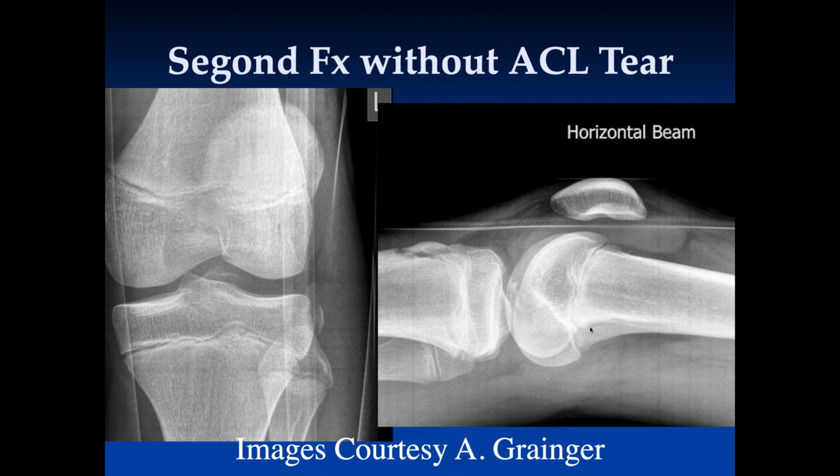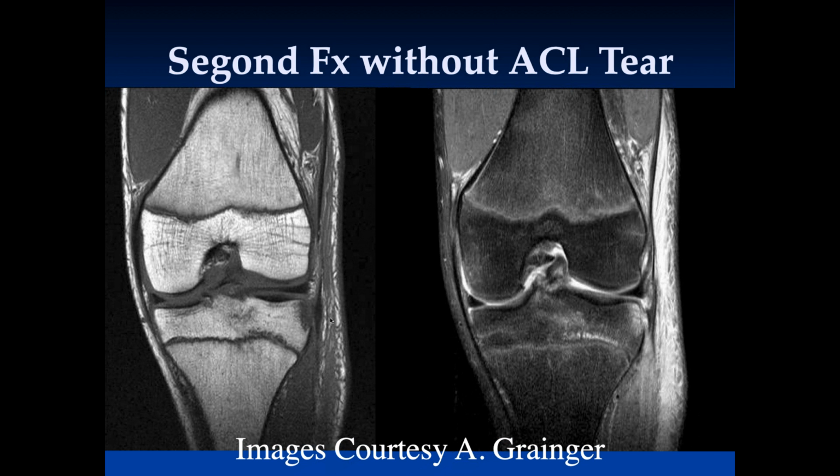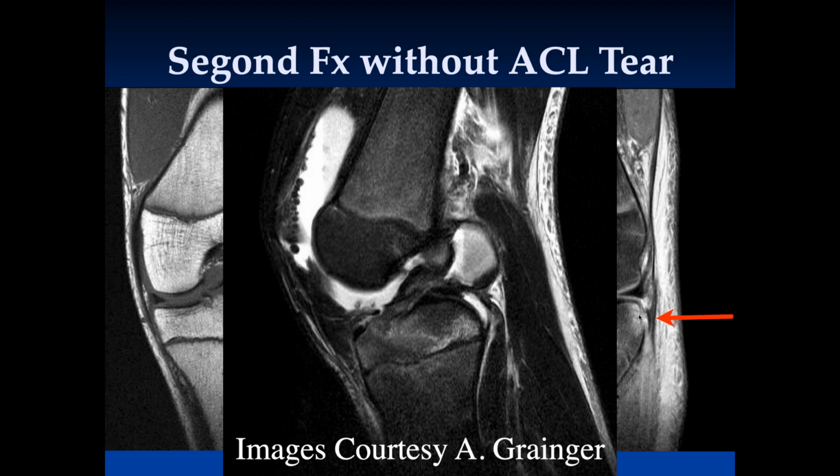Yeah. Rarely you can actually get Segond fractures without ACL tears. That's not as common. Pretty rare. Here we can see an avulsion of the anterolateral ligament, the typical Segond fracture, with a fluid level in this area.